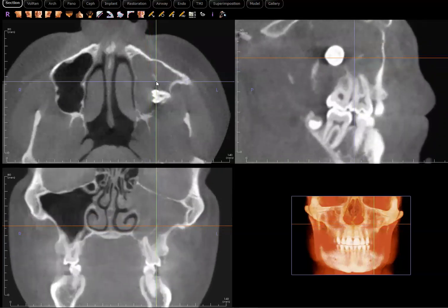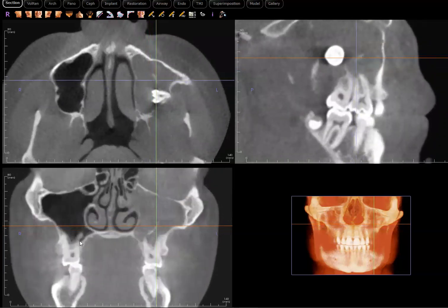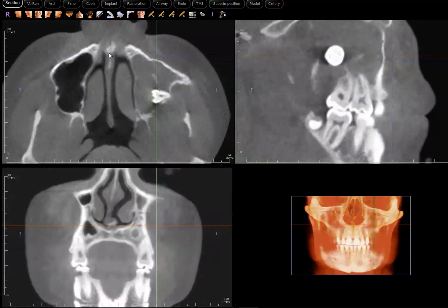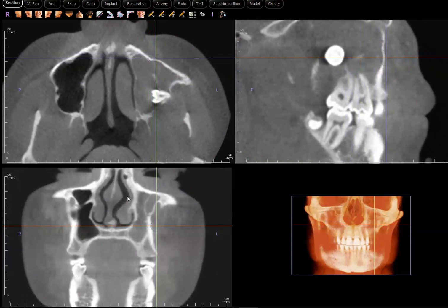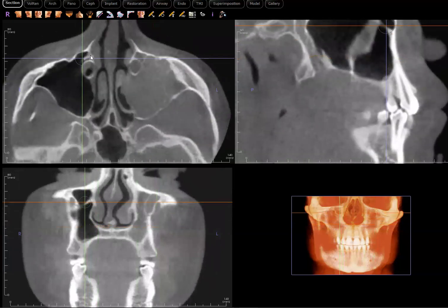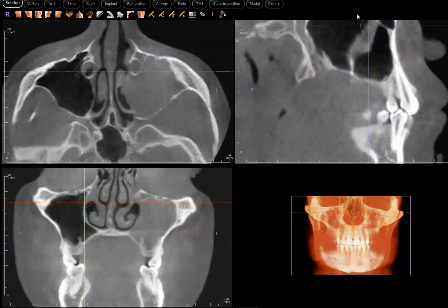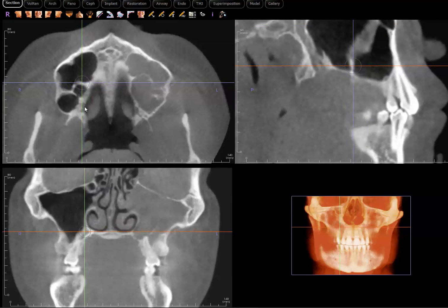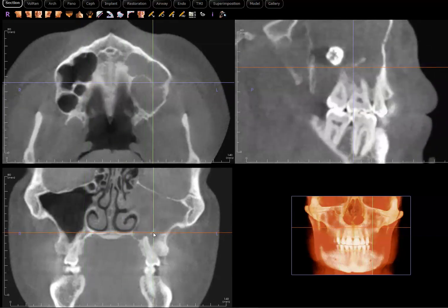Okay. Well, do we see that here as well? Okay, there is a septation, I think, over on that side. Is that a septation? I think so. I don't know exactly. I mean, this could be a septation that may have been displaced by the OKC. So I think that's a possibility.